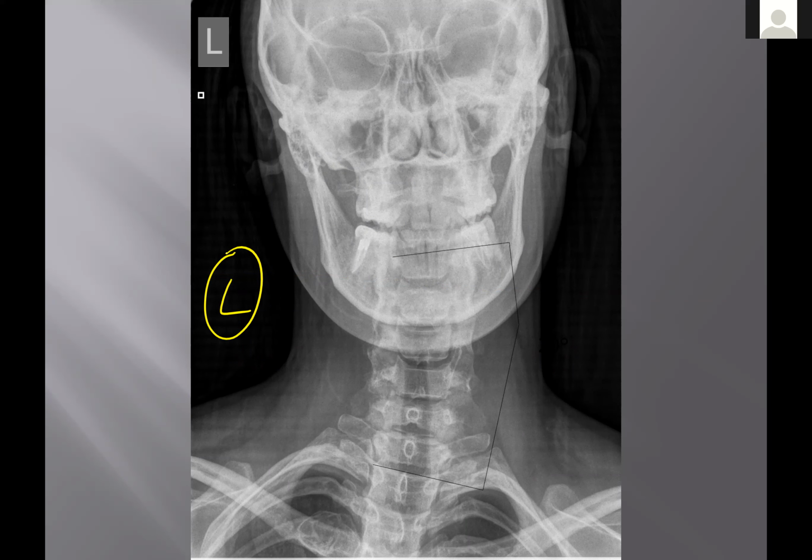Is there a slight scapular fracture, the superior scapula there? It looks like there's a lucency in the left side there, maybe. Right in here? Jeff, what about the sternoclavicular? A little lower than that. Okay. Yeah, I think we're starting to see it. I'm probably hallucinating. Yes. I heard third rib.